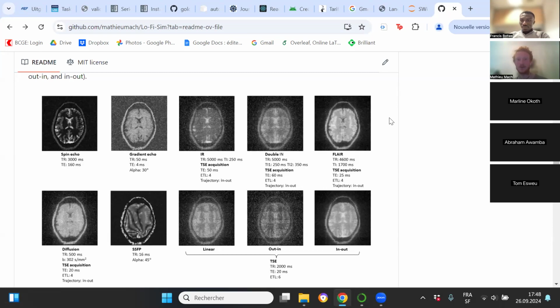And for everybody listening, we also have, with Francis, talked a lot about the different issues one could have when you run the code. So we have kind of a log of all the different errors that you might encounter, and we could also put this on my GitHub. So if you have some problems with running the code, you could also go to this log to see if a previous person had some problems.